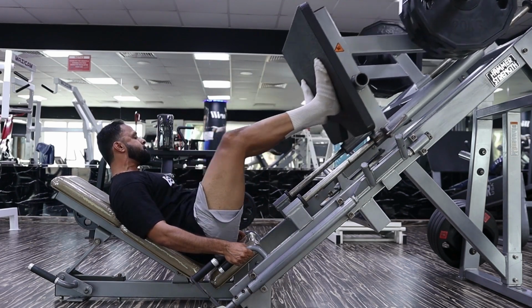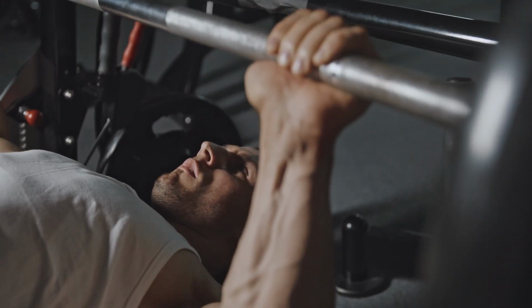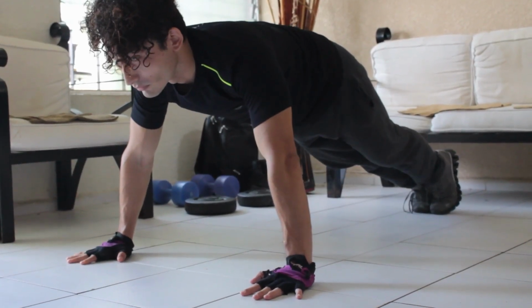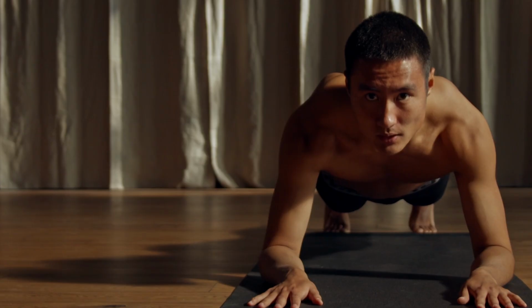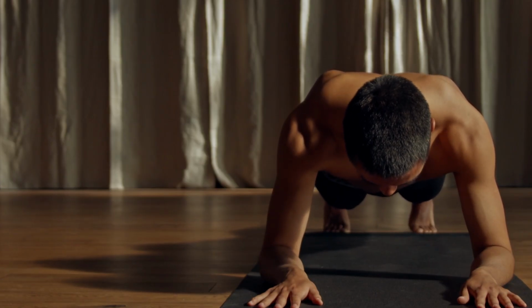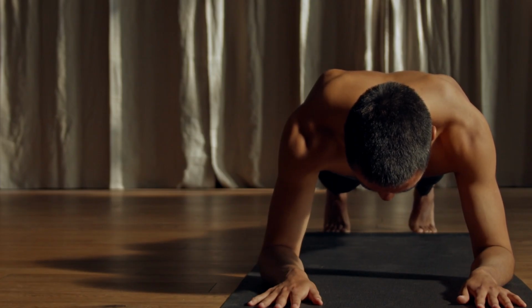While if somebody has less muscles in their upper body, then upper body exercises like weightlifting or simple exercises which can be done at home can be recommended. Lastly, if someone has less muscle mass in their core, which is the trunk, then core exercises like planks or even squats can be very helpful. So something like that can be advised to the patients.